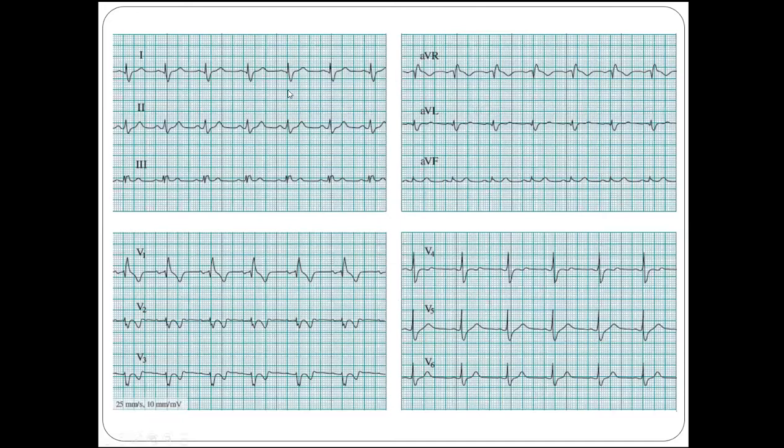Here, very similarly, this is what you decided. Okay, this is rhythmic, fine. The rate is around 70, maybe a little bit more, 80. Okay, we have a P wave. Yes, we do have a regularly coming P wave. PR is normal. The axis is about normal. AVF is about normal, but 90 degrees or so, very close to 90 degrees, because that looks isoelectric.